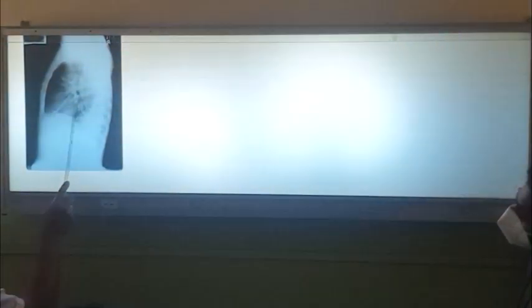And this is a right lateral X-ray. So in a right lateral X-ray, the inner one is the right, the outer one is the left thoracic cage. Starting from the left side, it is the left hemidiaphragm, right? Left hemidiaphragm, and the anterior part on the left side you can't see because of the cardiac shadow there, right? And then this should be the right hemidiaphragm. Then this should be the right-sided oblique fissure, fluid in the oblique fissure.